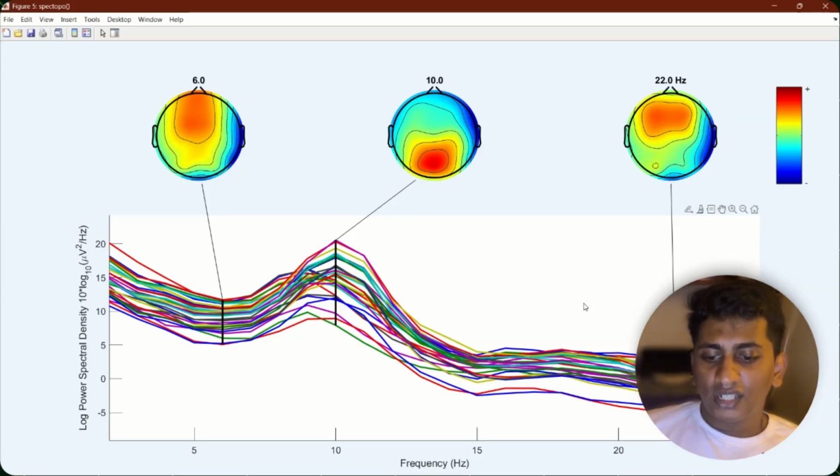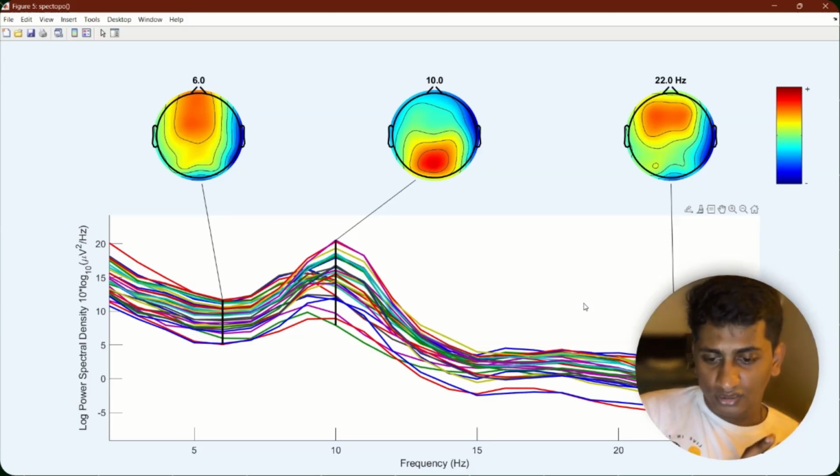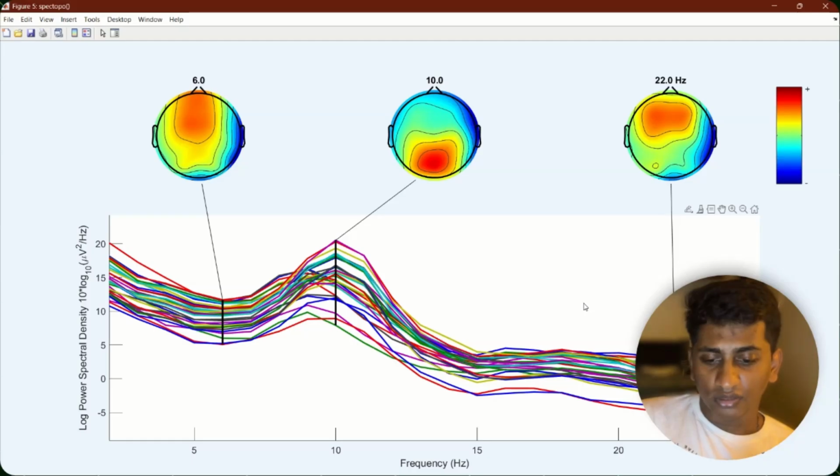Now we have done the filtering, and filtering is critical. I'll apply a zero phase FIR bandpass, with a low cut of 1 hertz and a high cut of 40 hertz. Why these numbers? For ERP and motor imagery, we want the mu band, which is 8 to 13 hertz, and the beta band, which is 13 to 30 hertz. Basically, it goes up to 30 hertz and is preserved.